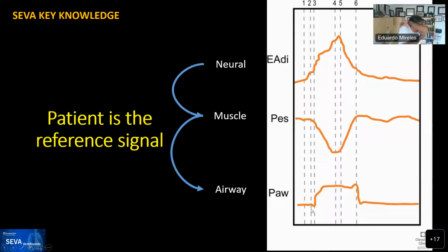All right, so let's get started. This is our first signal. This one is courtesy of Ariel Garnero, so I put that here, and he gave us this graph. So it's there for you, and we always go in order. The first thing is to define the tag, followed by the load, followed by going in order: trigger, inspiration, cycle, and expiration.